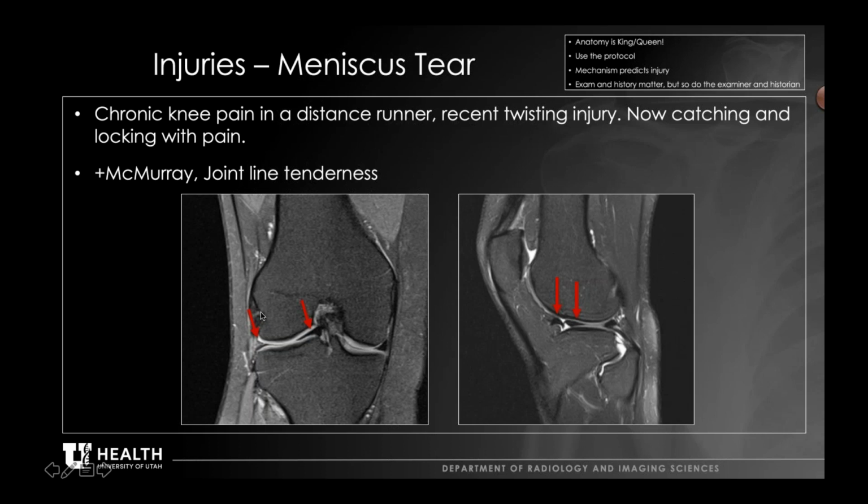The popliteus tendon. Very good. So the popliteus tendon is the one that courses intra-articular, and it attaches right there to this little notch in the femur. You can actually see portions of the tendon right here. So yes, that's a normal appearance. Thank you, good question.